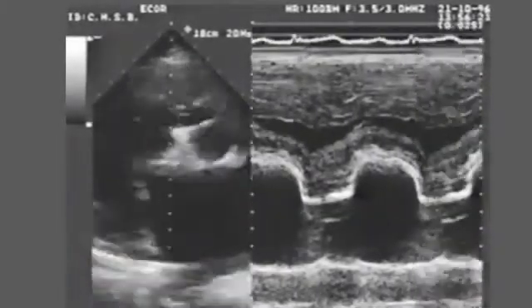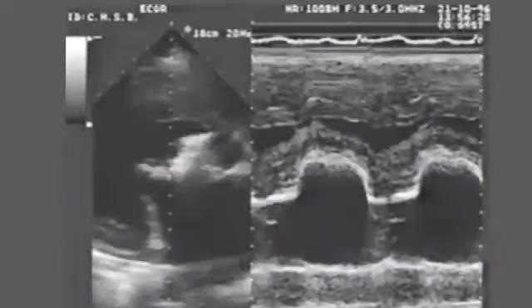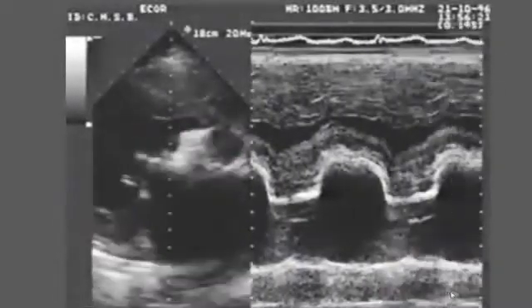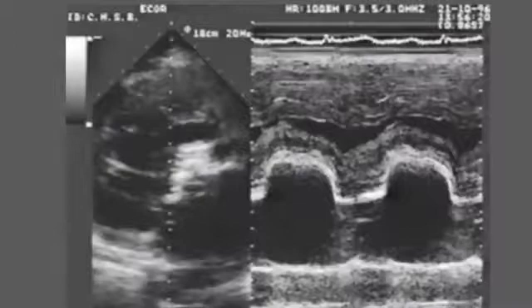What we see is this well delineated border of the echo from the base of the mitral valve and a large vegetation with its smudge appearance that we did not identify by 2D echo because we thought it was a calcification in the aortic valve and not a large vegetation, well demonstrated by M mode. See also the torn paper sign.